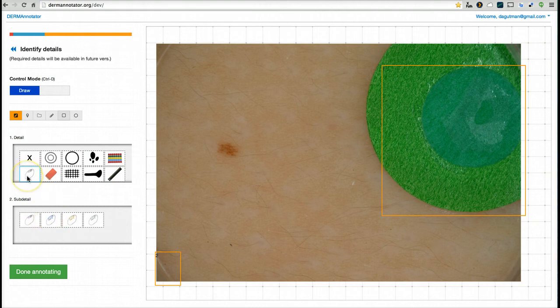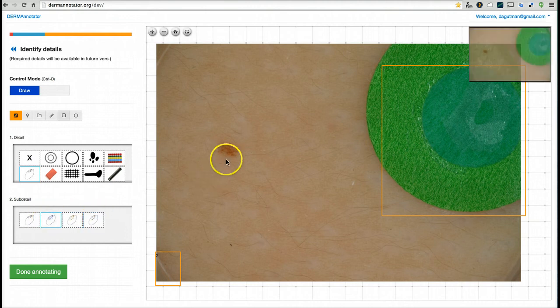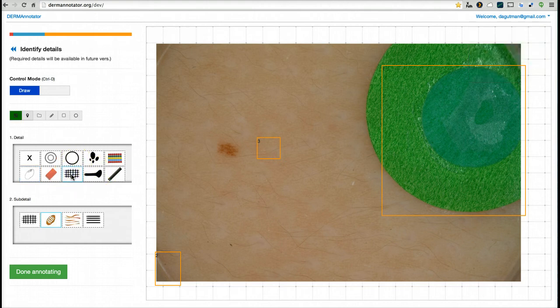You can see here, this is a little bit hard to see. We'll probably make these bigger. These are some spots. This is the blue version, the brown version, the red version. So I'm going to pretend there's some spots here. We can adjust the colors of these different objects. I just haven't done that yet.